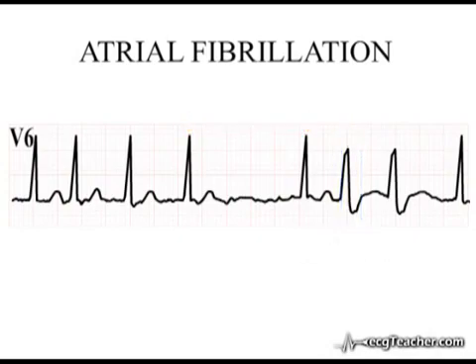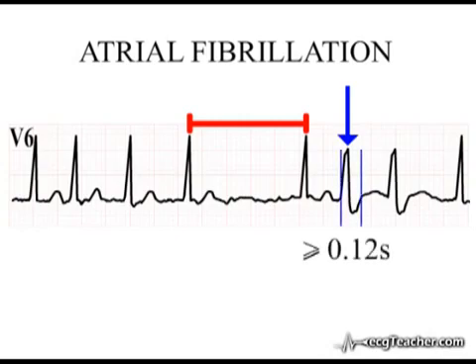What has happened in this case is that the bundle branches' refractory period has lengthened during this prolonged gap between ventricular depolarizations. An early transmitted atrial depolarization wave has then encountered the right bundle branch while it is in a state refractory to transmission. Aberrant conduction results in the presence of a broad QRS complex.